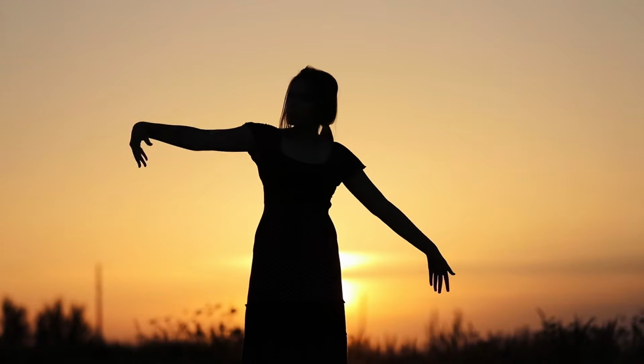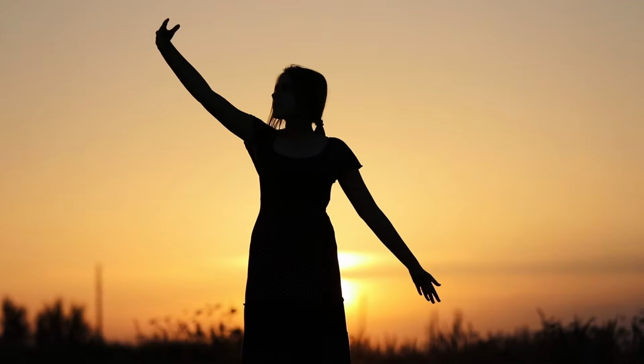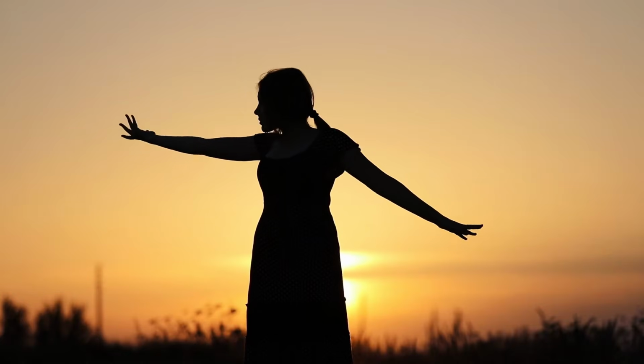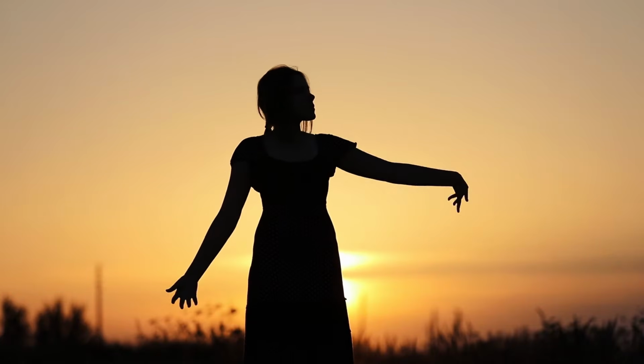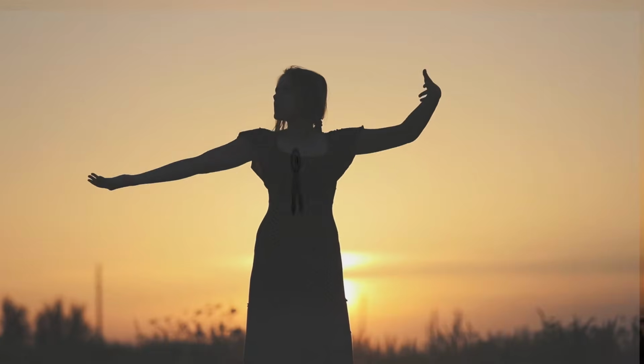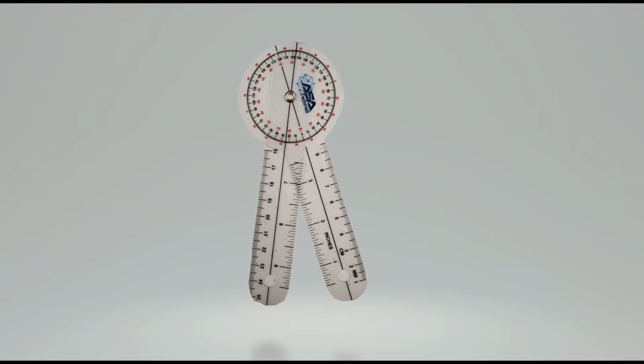People need the ability to move to function. Some people rely on technology to help them move, but for many of us, we count on the musculoskeletal system. One of the prime treatment goals in physical therapy is to improve range of motion. To be able to determine if we have made progress, we need data. For joint motion, that data is collected using a goniometer.